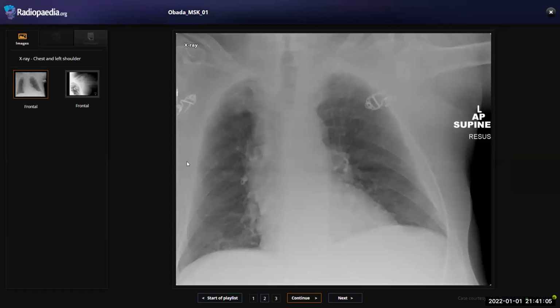Okay, this is a frontal projection chest radiograph of the same patient. I cannot see any visible abnormality in bilateral lung fields. There is no area of collapse or consolidation. The cardiac shadow and the mediastinum appear normal. The costophrenic angles are normal. The trachea is central. I can also see the left shoulder, in which the bones show generalized decreased bone density, and the hand is in abduction, and there is a loss of congruity at the glenohumeral joint.